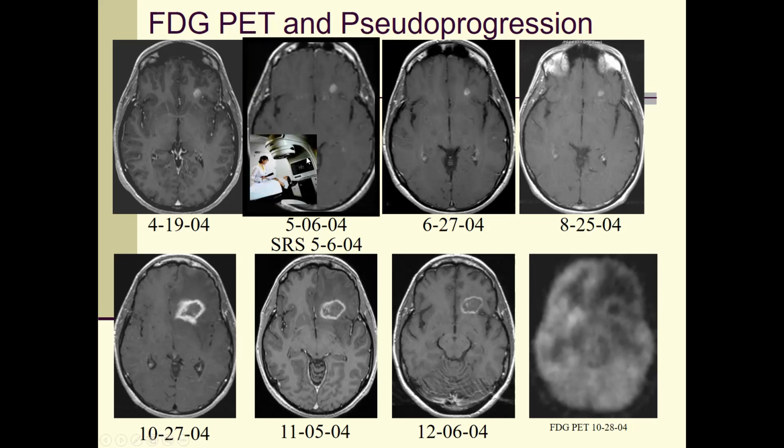So you see the radiation was done here, and some effect is happening, but eventually the surrounding tissue necrosis happens later on. When you are looking at this, it looks like an increase in size of the tissue itself, but eventually the mass is treated, and the surrounding irradiated tissue became necrotic.